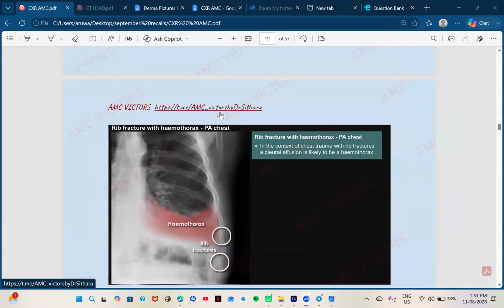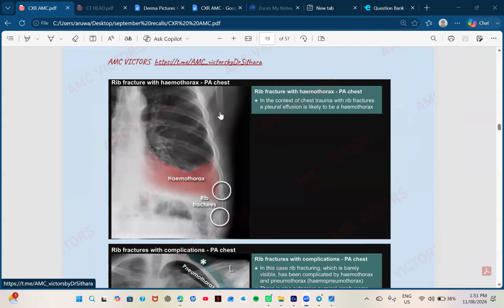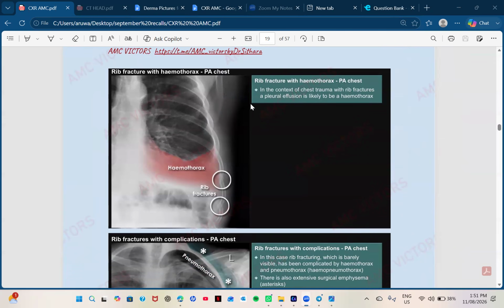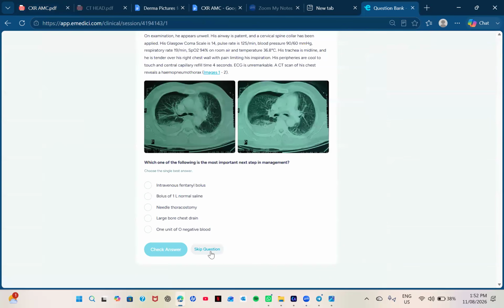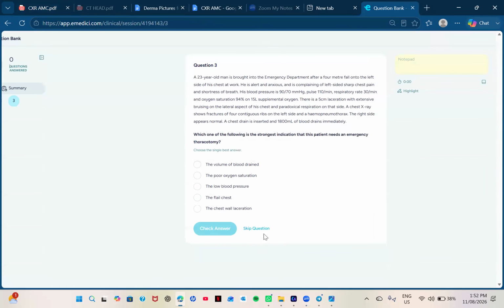Do you remember in the July exam we got a question with a rib fracture? Rib fracture, very important. They gave a scenario with hemopneumothorax both present, and there were rib fractures as well. I think after initial stabilization or initial interventions, the patient is still having pain or something. I can't remember that, it is the image question. I'll show that question, one minute. You August doctors, go with that question. That is very important.